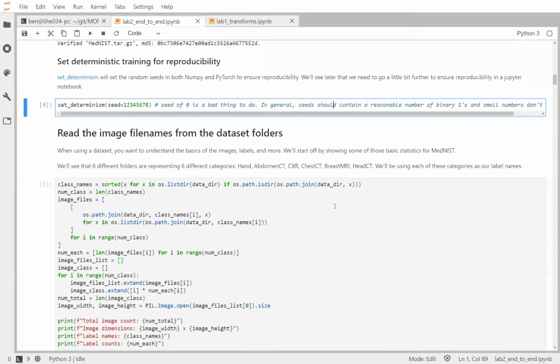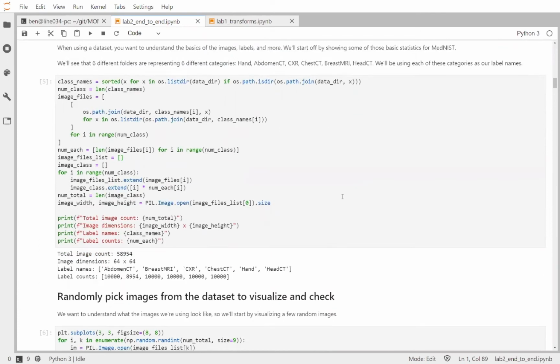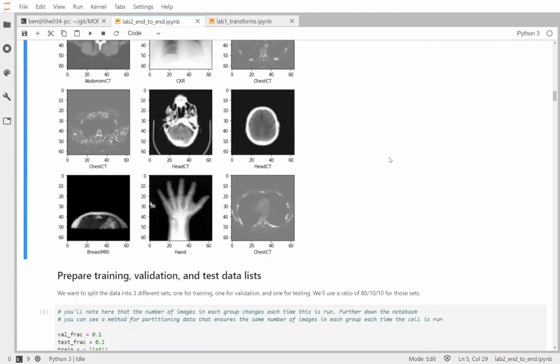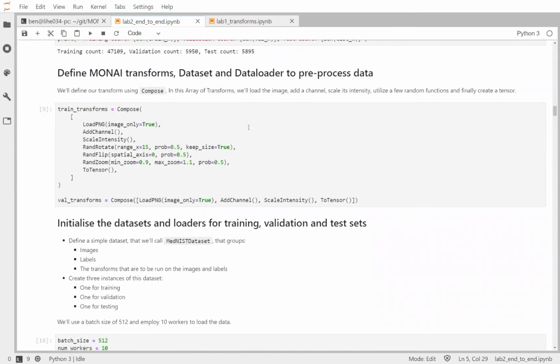As we'll see, there are a few places in this notebook where we call random state. Because the default use of most transforms, including the MONAI ones, is that they will use the global random state instance, because we're using a notebook, if we start clicking on things, we're going to change the way the network actually runs. For example, if we run this cell multiple times. So what we really want to focus on here, I think, is the MONAI specific stuff.